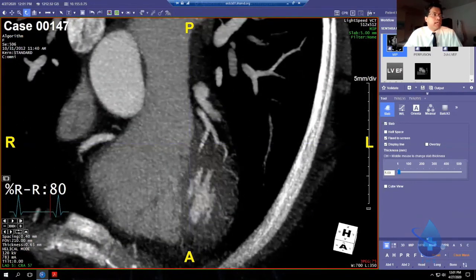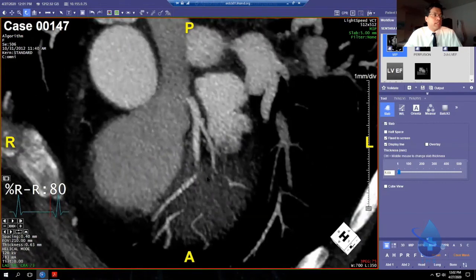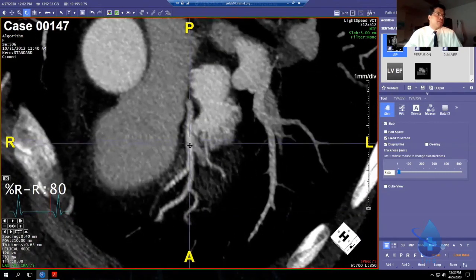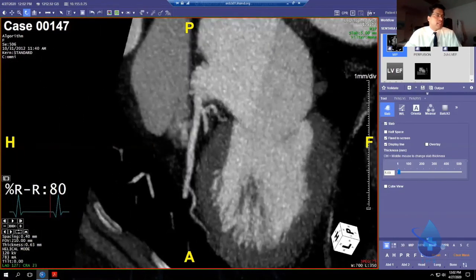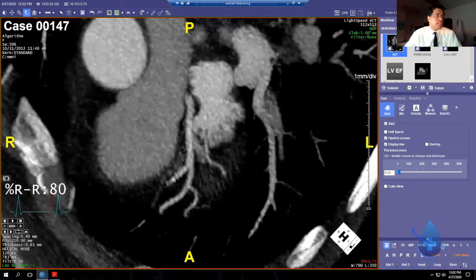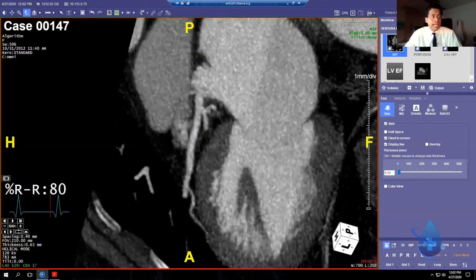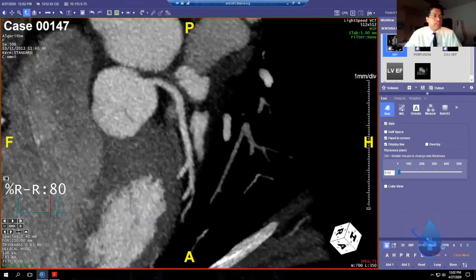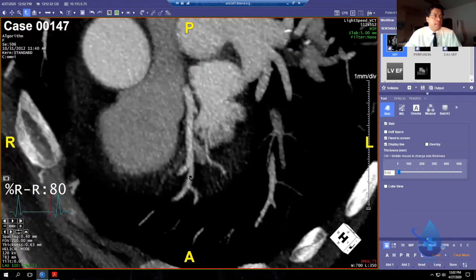When you're looking at an LAD or any coronary vessel, here's what I've done for 15 years: I look at the vessel left and right, 90 degrees across. I left click here, I rotate 90 degrees over here to look for any eccentric plaque that might be out of plane. Then I rotate back. I left click here and I rotate 90 degrees this way and I rotate back. I look for any plaque. I don't see any, let's say, and I'll move on.